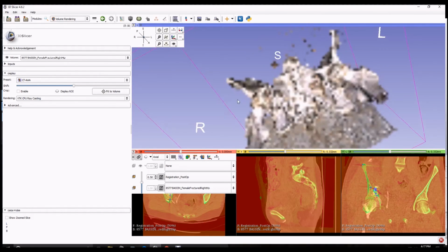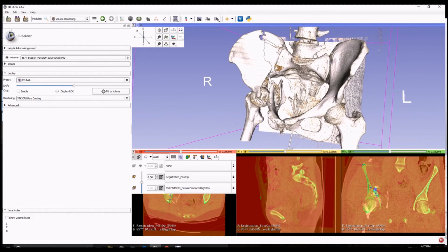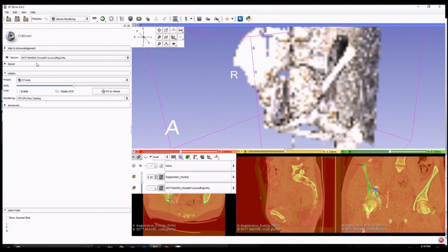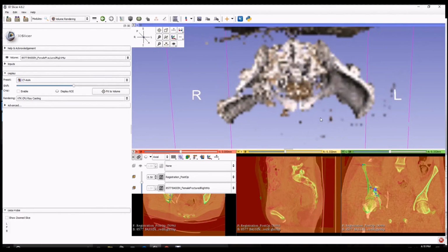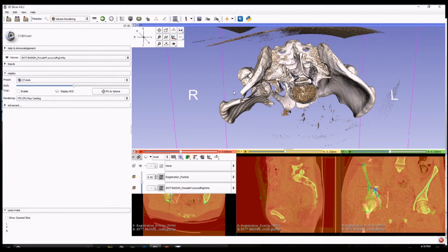I don't know what the pathology of this was. It looks like a pretty severe fall, and the femur pushed in through the socket. Definitely looks painful. Now, I'll try to find a view that helps to see the alignment. So now I will switch to the post-operation, and we'll see how this lines up.